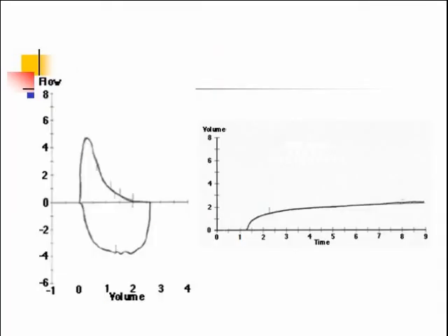Now here's the second spirometry that we're going to take a look at. Look at the loop. What does that tell you? Think back to those various loops we had in red. Again, we get an idea that this looks fairly normal, it would appear. The shape isn't so bad. We just don't know for sure how that's going to work out as far as the normal values.